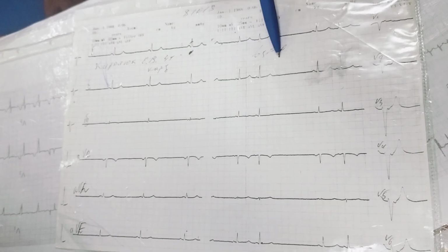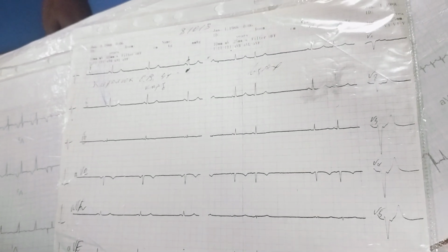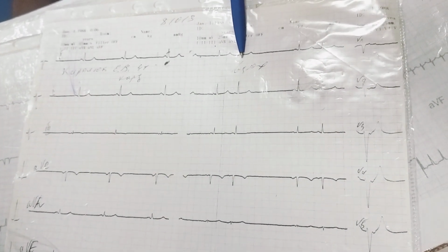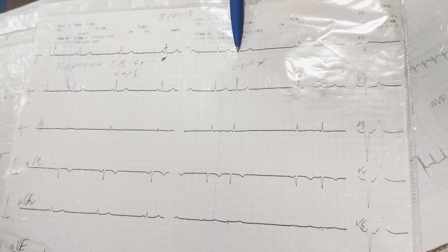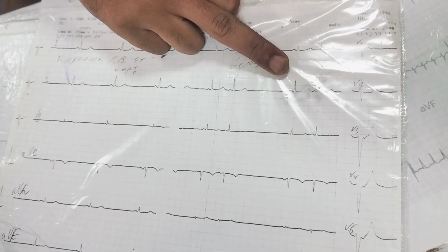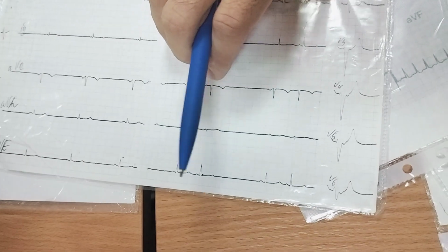And it's written inhale. It is sinus respiratory arrhythmia. During inhale, the patient has arrhythmia. So this is the inhale, this is the exhale. This part is inhale, this part is normal breathing.